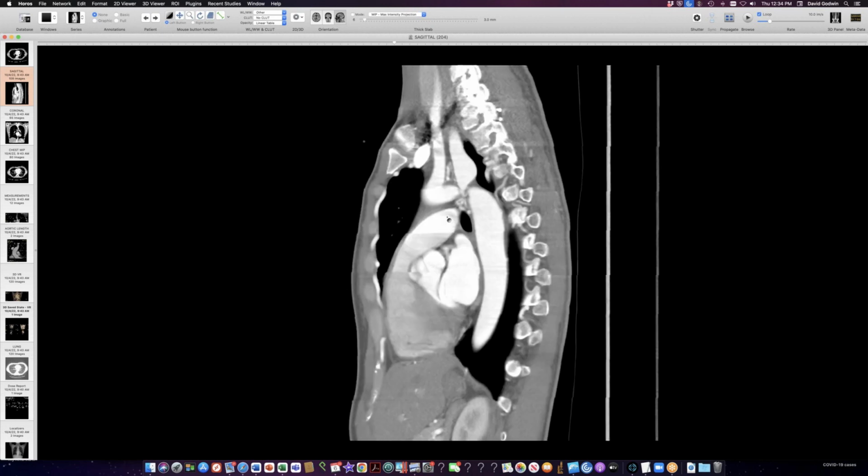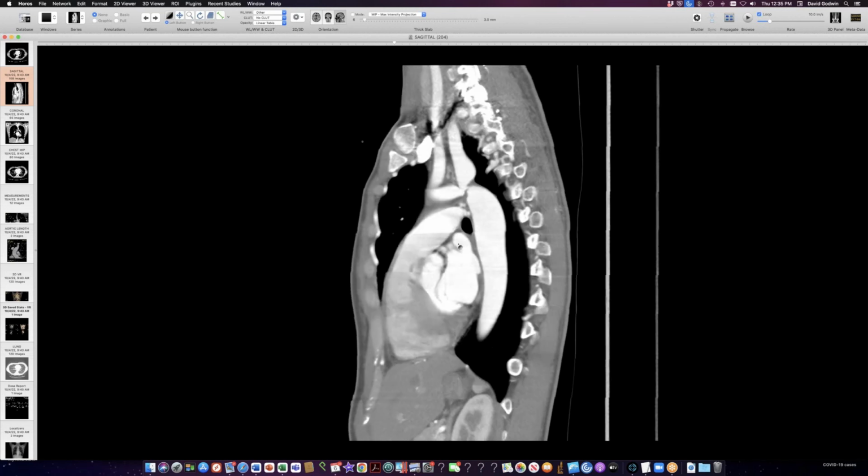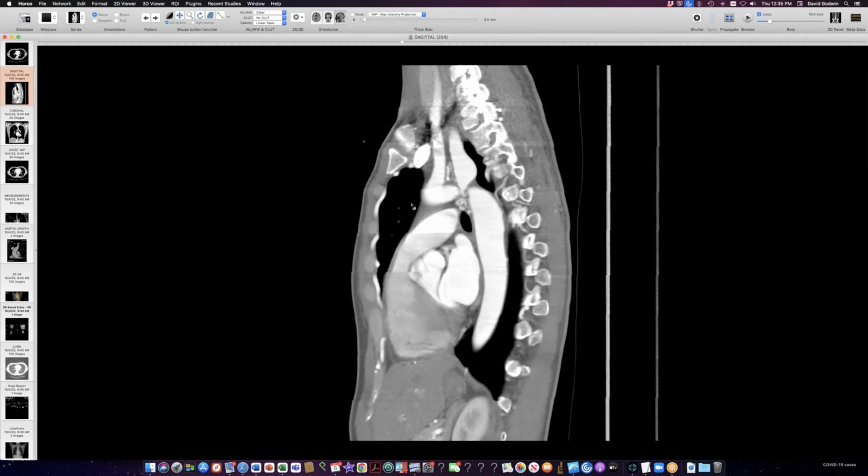Person did not have a bicuspid aortic valve. There was some ambiguity on the echo about the condition of the aortic valve, but we saw 3 leaflets, and we don't know whether the 3 leaflets are opening normally. There was no thickening and no calcification to suggest that there was a dysfunction there. So a very dramatic case of coarctation, untreated, no intervention in this woman, I think in her 30s or 40s.